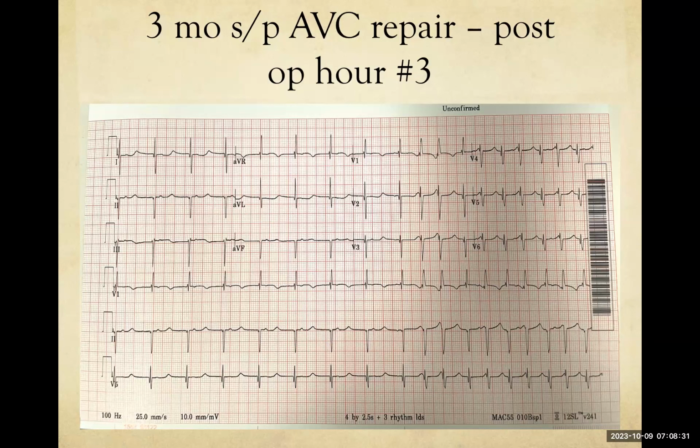It would look to the right. This morphology? Yes. Well, you had a 50-50 shot. This time we're wrong. No, it would look more like this, right? Because if this is junctional rhythm, it's arising from the bundle of His or the AV node. So when you're in JET, the QRS morphology should look pretty much exactly like it does in sinus rhythm, whereas when you're in VT, it does not.